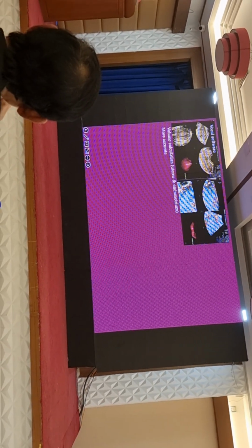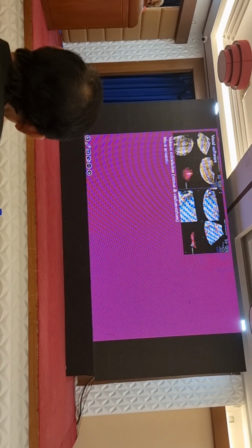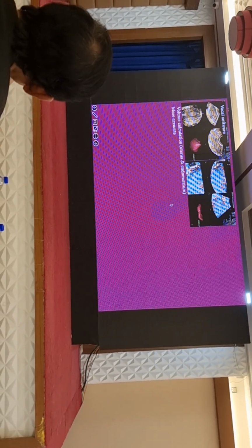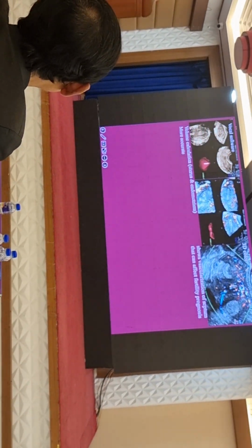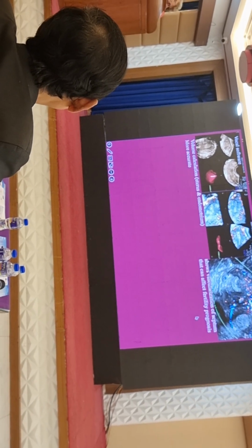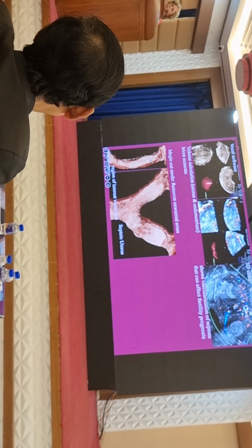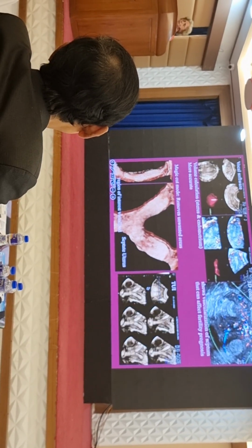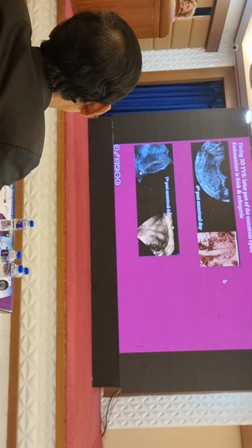With the VOCAL software, we can do the volume calculation, which is more accurate. We can also do the endometrial cavity evaluation, and this plays an important role when we are evaluating women with a unicornuate uterus. Now, vascularity shows if there's increased vascularity in the septum, that can affect the fertility prognosis. We can use this cut section to see the region of interest in the hemiuterus, and this is a septate uterus. And TUI gives the entire extent of the septum.